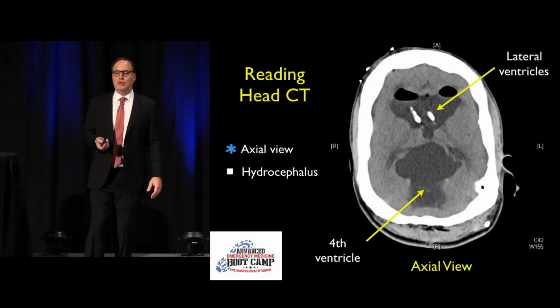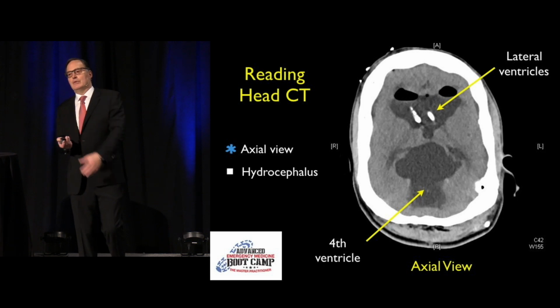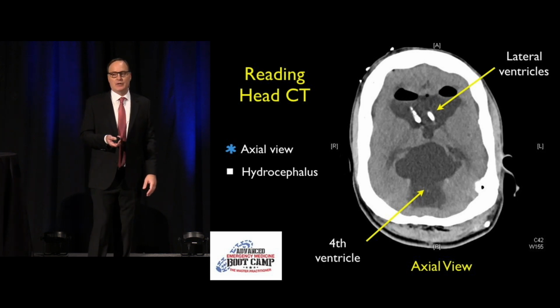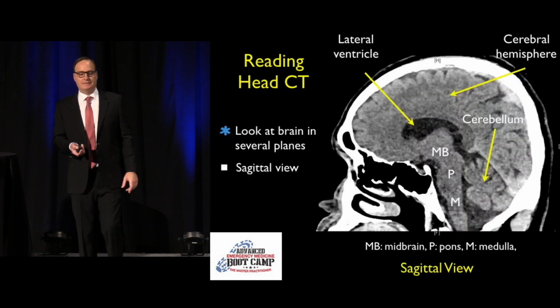Okay, so that is a communicating hydrocephalus all the way down to the fourth ventricle. Remember we said that if the fourth ventricle is involved, that's communicating. If the block is between the third and the fourth, that's a non-communicating.